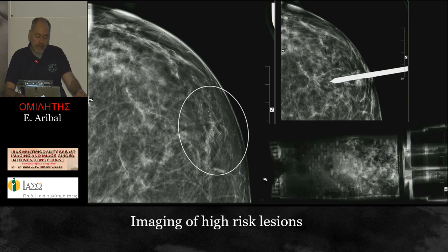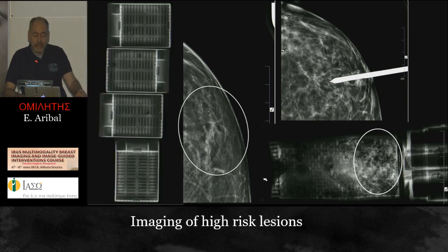And you must have a specimen mammogram. There you see the calcifications are removed, but in the pathology results, they said that they haven't seen any calcifications. When you receive a report or when you talk to your pathologist and he or she says that they didn't see any calcifications in your specimen, just show them the specimen mammogram, and that shows them that the calcifications were there. Maybe you may just separate the calcified tissue from the non-calcified tissue. That would help them. In this case, we didn't separate.